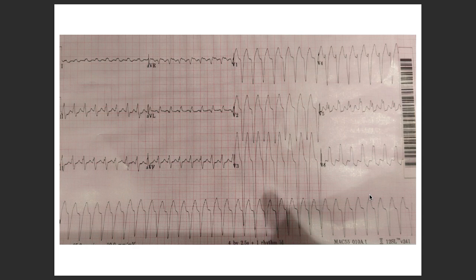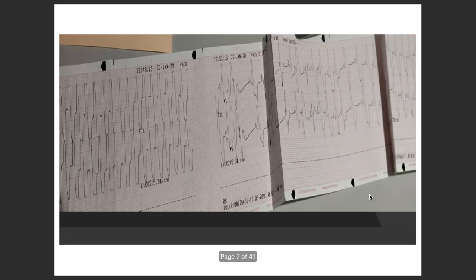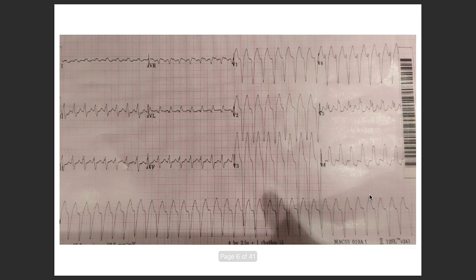So for example, this ECG, if you look carefully, the date is also written. In fact, so this had happened like 22nd of January. So 22nd of January, I was on call. I received a call from the emergency department over here in Manchester. They said, it's a VT. Please come over here. We want to shock this patient. I said, please, can you send me the ECG? I went through the ECG. I said, no, there's no shocking.